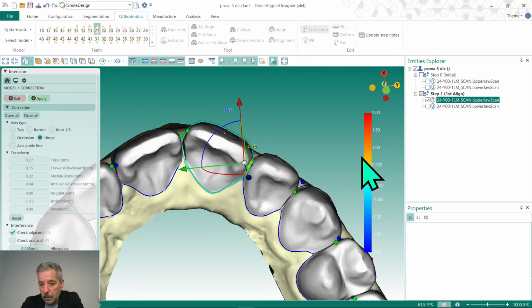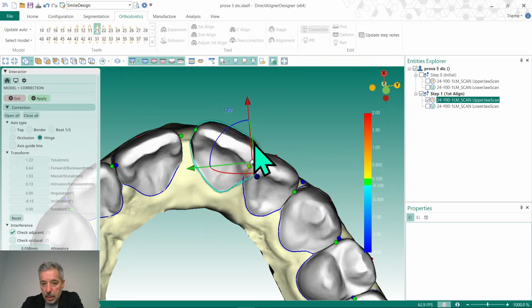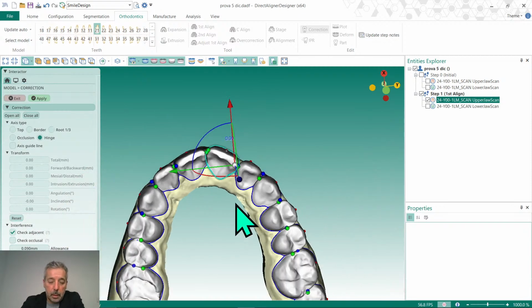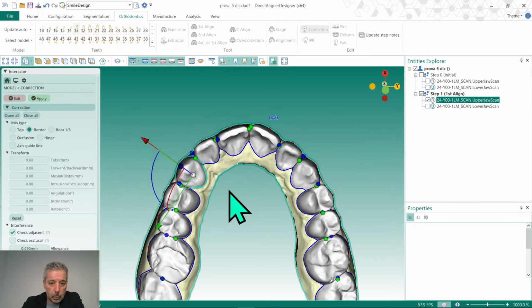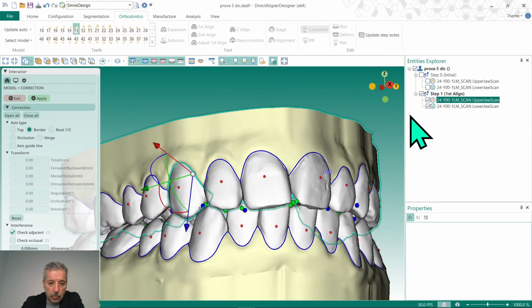You are here now. And if you go down and down and down, the color changes, like you have here now, and also you are orange here, 0.92, and this one, or maybe this one, it becomes red. Okay, that's it. Basically, now we are ready to start with this planning. Okay. We check the occlusion and we detect some movement.